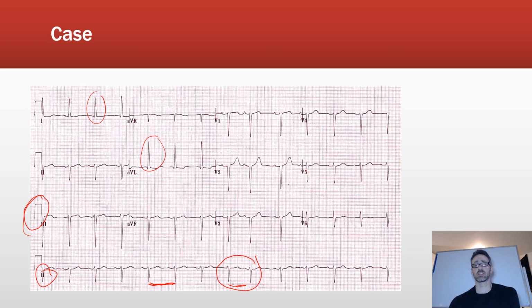In other words, is this little blip that we're seeing here due to some kind of regular sinus type rhythm, which you might see with a respiratory sinus arrhythmia, where it speeds up or slows down based on their breathing pattern? That might be helpful to know.